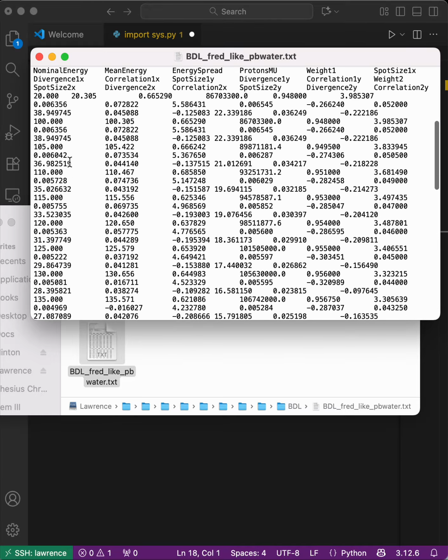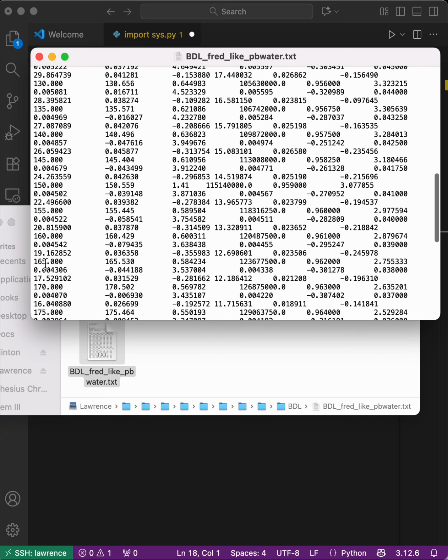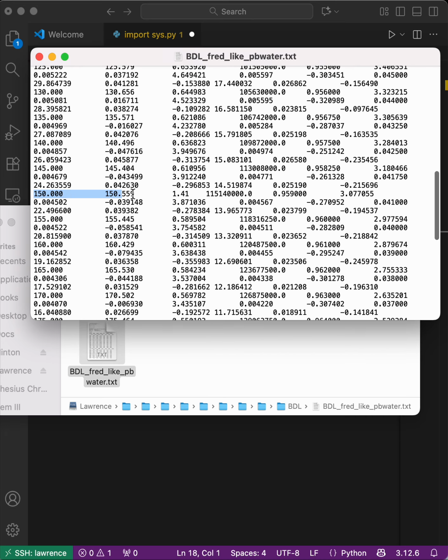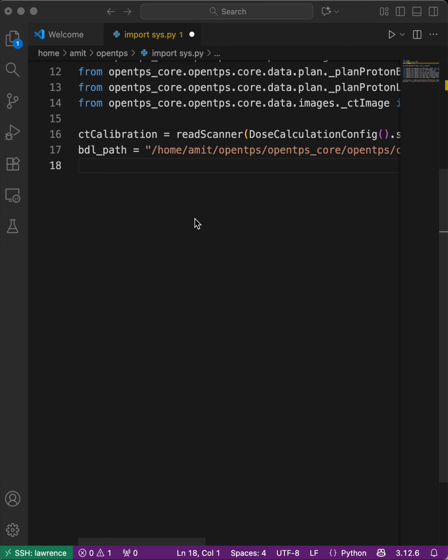And then I wanted to keep the energy spread with full width at half maximum of 5 MeV, and I changed that by changing this parameter. You know, by using the formula FWHM is equal to 2.35 times sigma. Anyway, these are the changes I made so that I can make the simulation as I want.